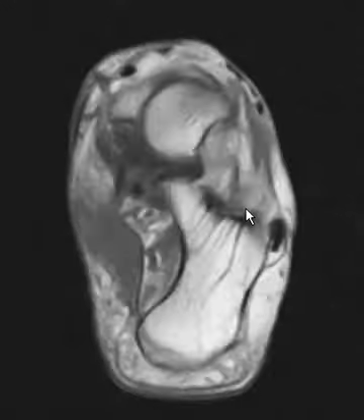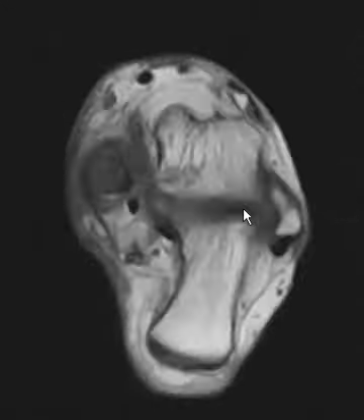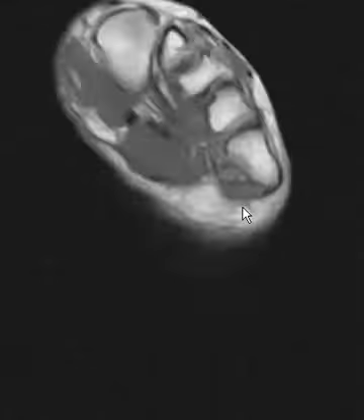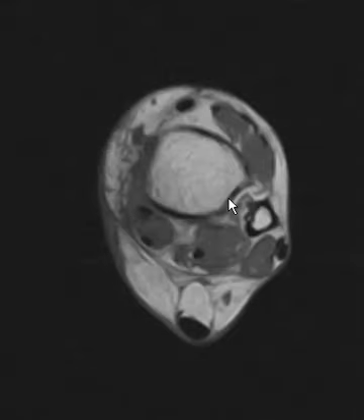Hello, this is Dr. Gay from First Look MRI, and this is a 55-year-old woman who has really bad swelling in her medial ankle and foot. She says she's had flat foot deformity, and her podiatrist sent her in to look at the ankle here. And she said there's pain, but it's not a whole lot worse than before, just much more swelling lately.